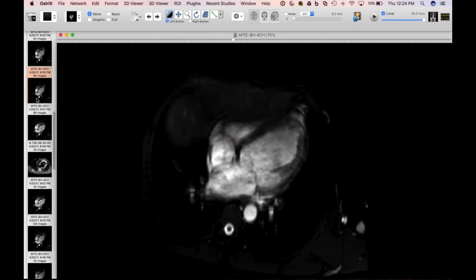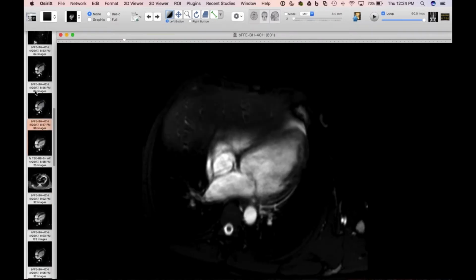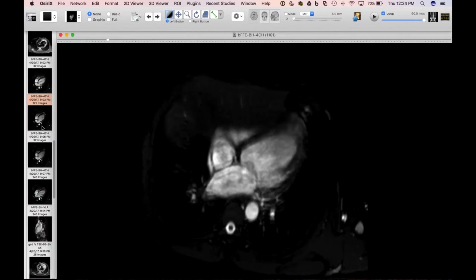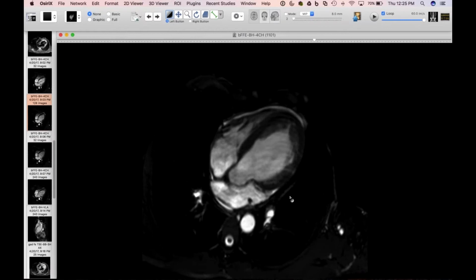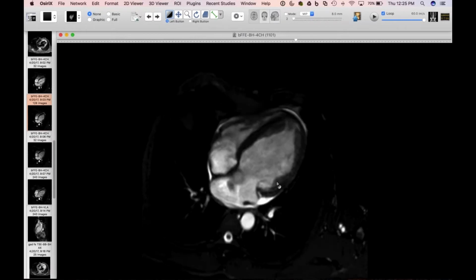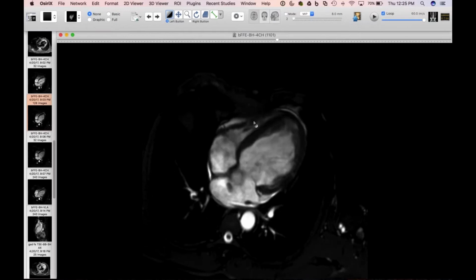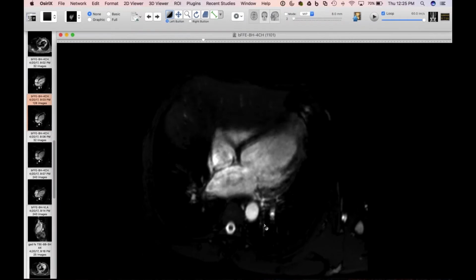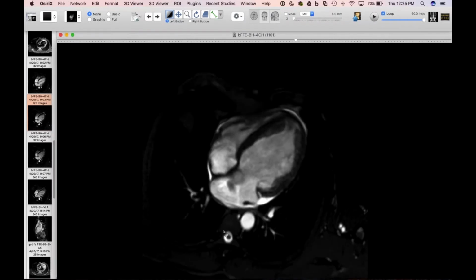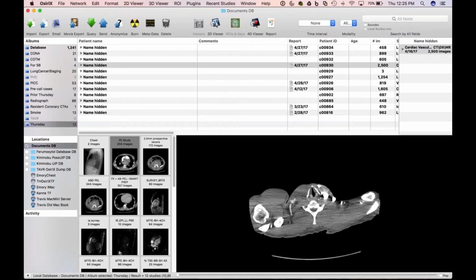Yeah, it's normal. The other thing I didn't show you too is on his thin slices, because the Loeffler's patients often will have reasonable function, and he just has no function. I mean, you can see why he's accumulated thrombus there. It's just, you're right, motion. Apparently, the echo said there were no wall motion abnormalities, but that's an interesting place for the left atrial thrombus too. I know it's a little weird. I agree. But interesting case.